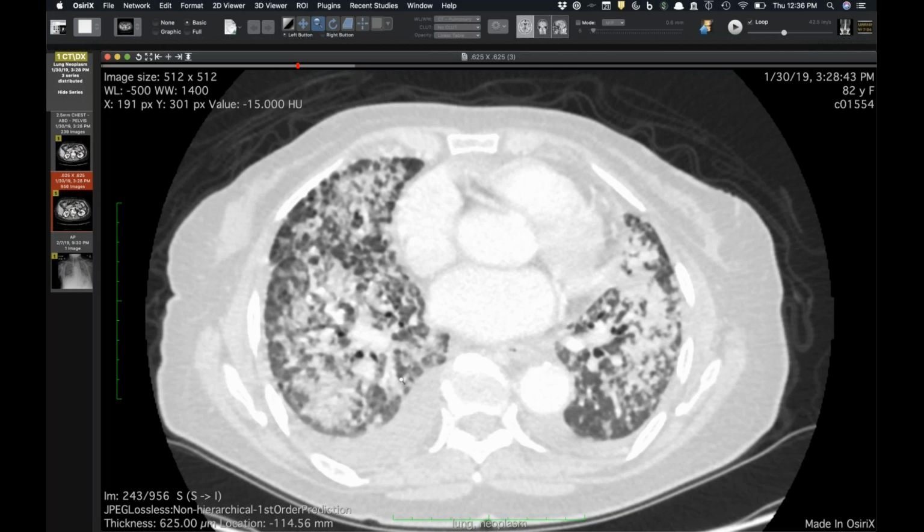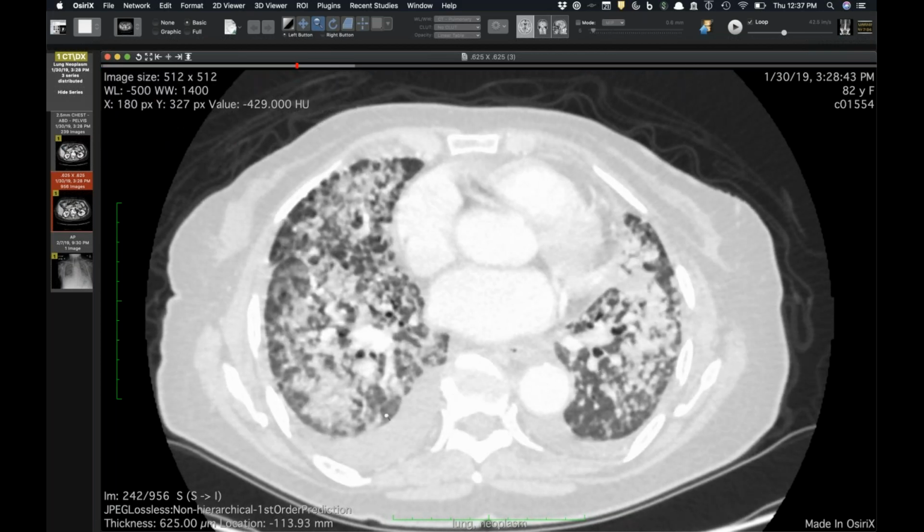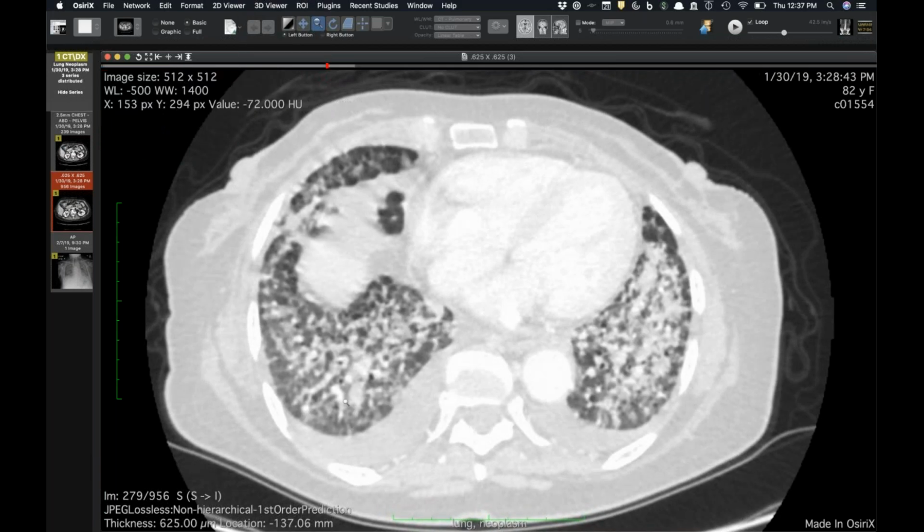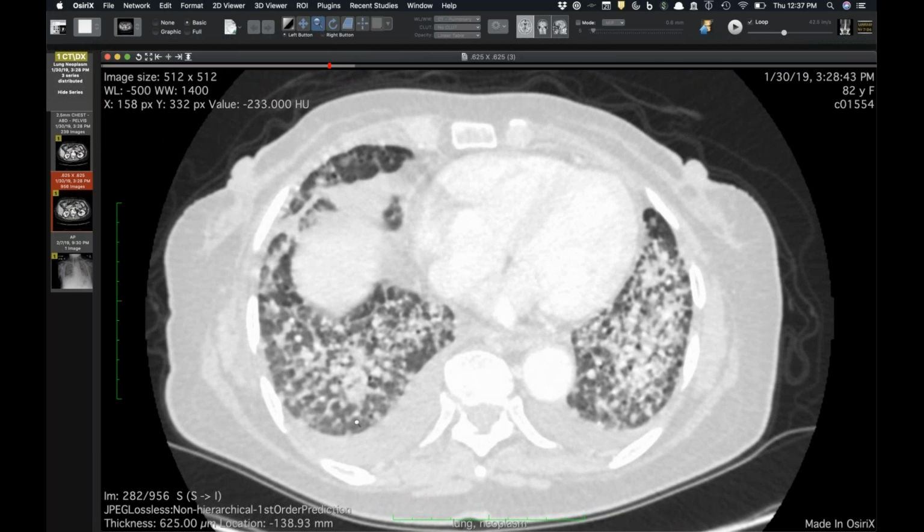What I think is interesting, though, is we see different patterns of diffuse, right? Because sometimes you'll see more of that pneumonic, where it's just diffuse ground glass and even consolidation and crazy paving to some degree, whereas this is just diffuse nodules. So I don't know if that also has something to do with it too. I don't know.